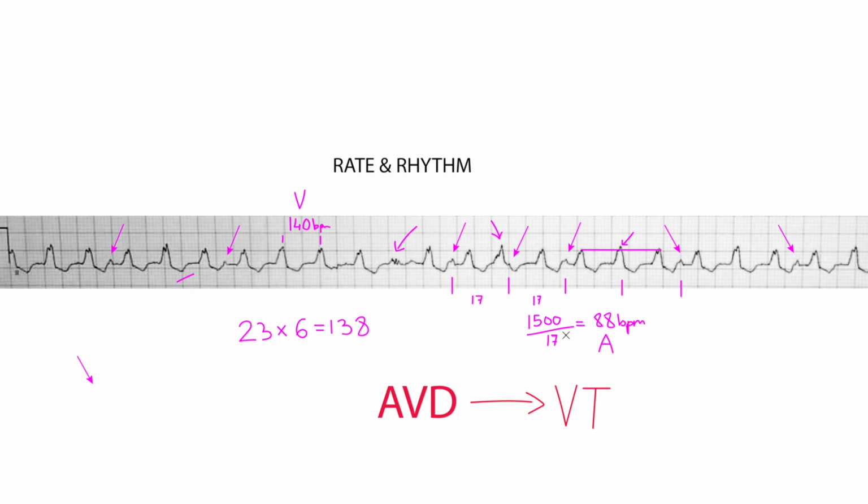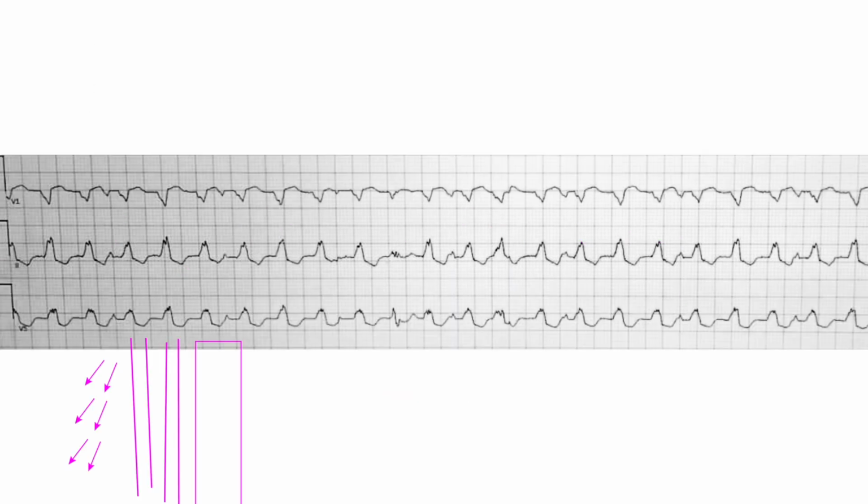How can I say this? That's the main force behind what's forcing the blood into the system here. Okay. All right, let's keep going. Let's see what else I can get. I'm going to have to come back to this and try to figure this out. But so far, I'm strongly suspecting ventricular tachycardia. Okay, let's see if we can prove that.